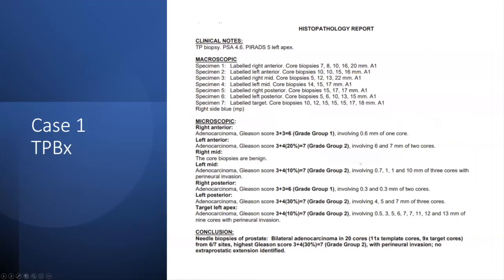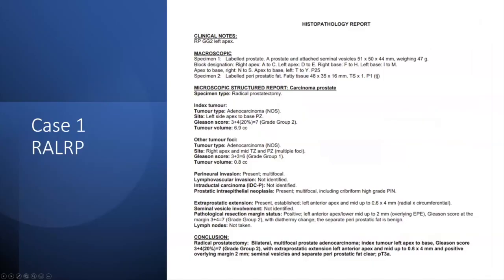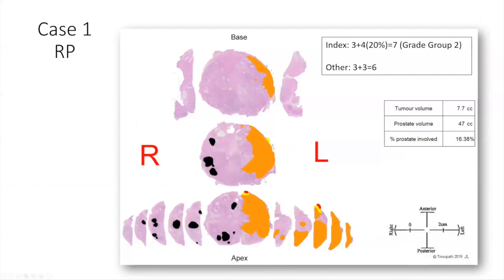Wasn't particularly. These are always hard, sorry, go back to here. These are always hard, especially, we're saying its radial extent is 0.6 millimeters, but when there's a positive margin, that's what we're seeing. Because the tumour extends on, we never know whether the radial extent is actually a little bit more than that. But look, that's hard because Richard's always said about the circumferential extent of capsular abutment, and there's really quite extensive. So it's a bit random that it's actually just in one site.